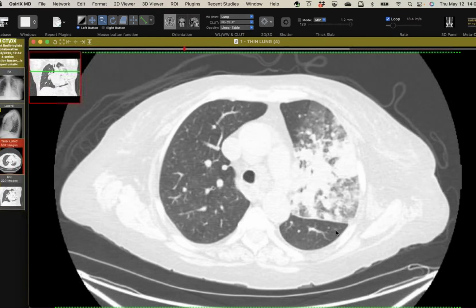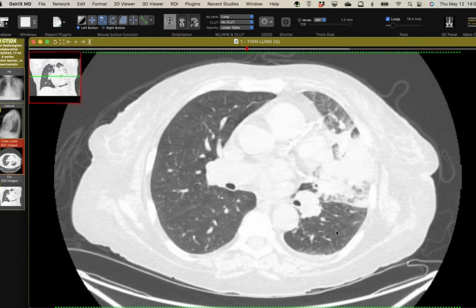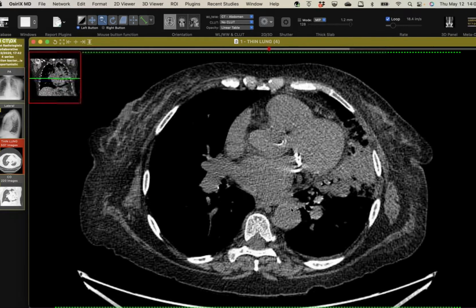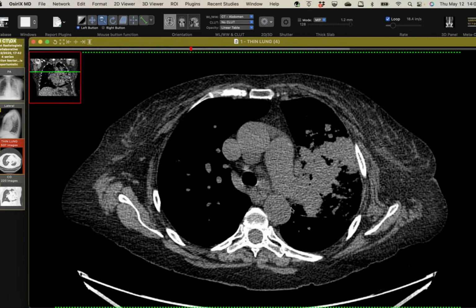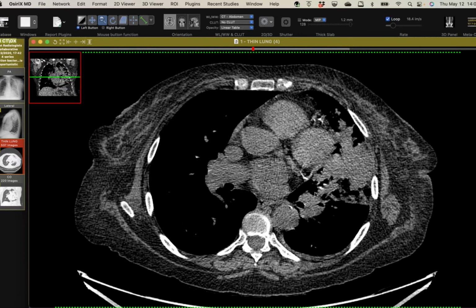So it tends to cause large masses, cavities. You'll notice there's not really much in the way of pleural involvement. There's a tiny effusion, which is probably more reactive. And she did have a little bit of lymph node enlargement, but nothing terribly exciting that you typically would see with, say, pneumococcal infection or staph. So normally when I see this, I think about blastomycosis, but especially in an immune compromised patient, consider Nocardia as well. All right, well, those are the two cases I have from this week. And I'll turn it over to Travis.